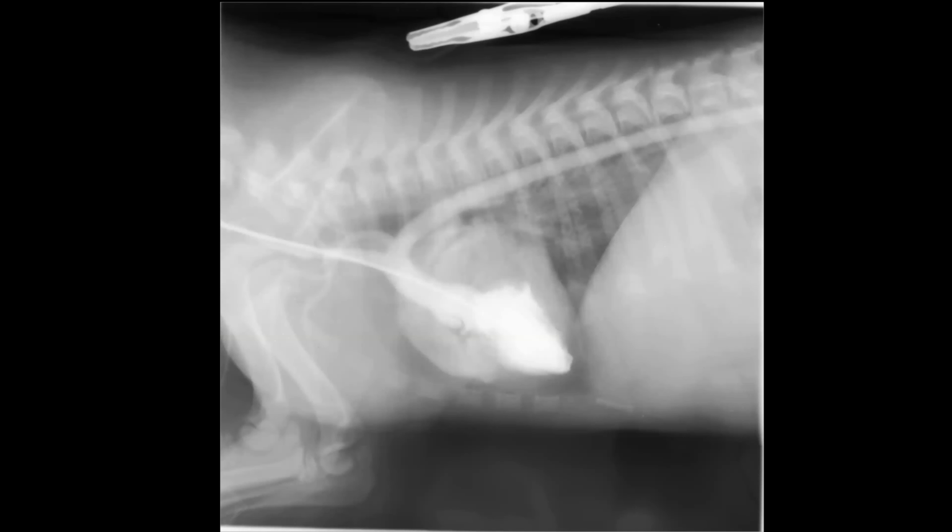Okay. The good thing in these dogs and cats is that if the VSD is relatively small, like this one, a lot of times as the animal matures and gets bigger, they will heal themselves. They actually occlude. On the other hand, if it's a really large bore VSD, that's probably not going to happen. Without treatment, some of these dogs that have really small VSDs will do fine. They may be totally asymptomatic. On the other hand, if they have large bore VSDs, they probably won't make it to be a year of age.